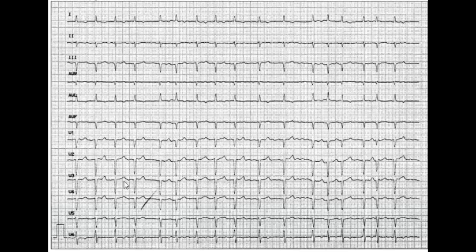So yeah, the pathologies in this ECG are atrial fibrillation, which we discovered because the action is irregular. The chronic myocardial infarction with the scar, because there are pathological Q waves in lead 3, AVF, V1, V2, V3, and V4. And the last one is left anterior hemiblock, which presents as left axis deviation that is not explained by anything.